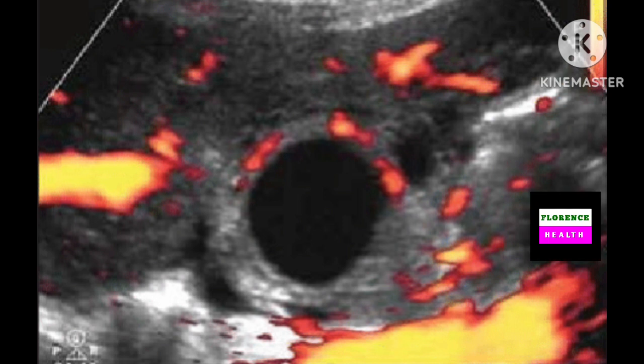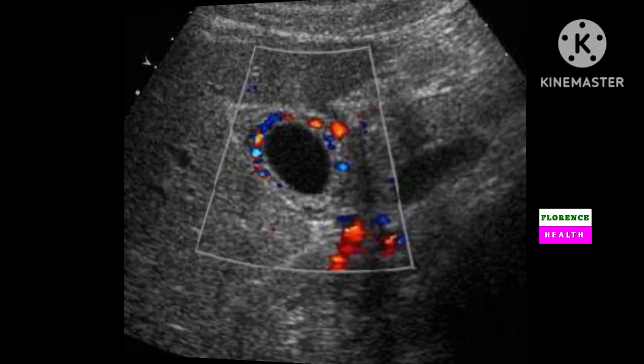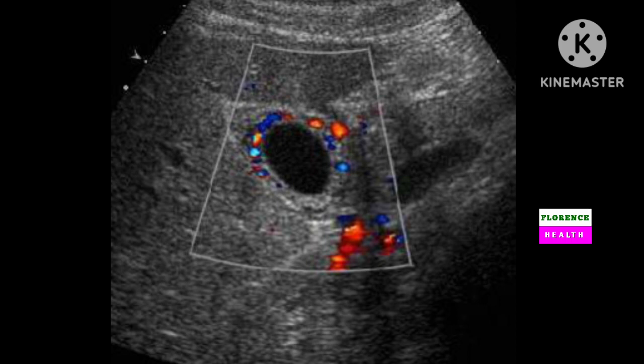In acute inflammation, on taking the help of color box, the gallbladder wall will take color. Due to inflammation present, it will cause hypervascularity, as in figure. Let's discuss how it differs from non-inflammatory conditions.